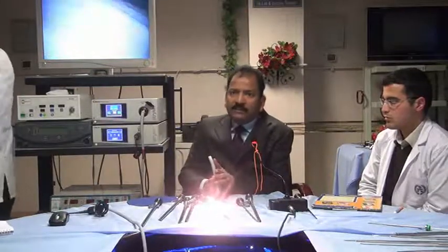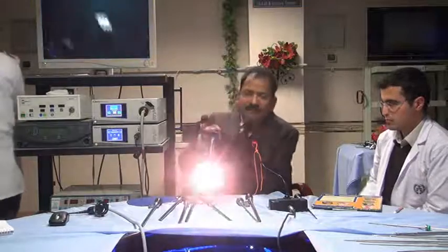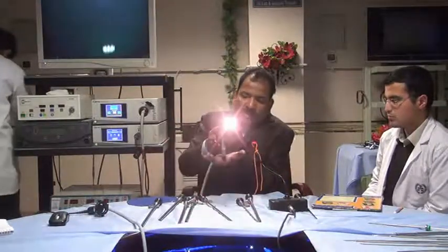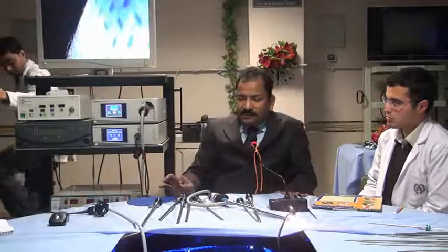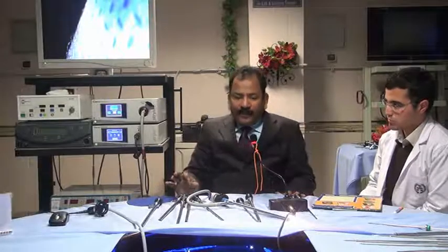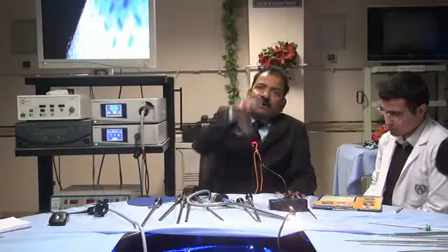Why? There are two reasons. One reason is if it is down and you press towards the abdominal wall, the fibers will break. And another reason is you will get a bad shadow. I will tell you, in older times when they were making the telescope, they were making the fibers all around.